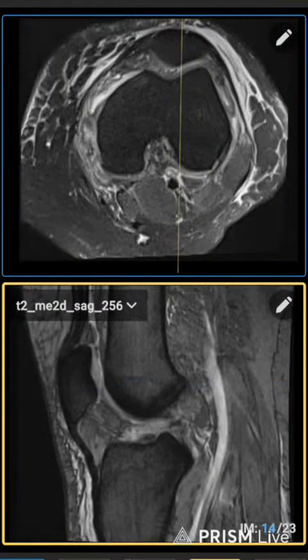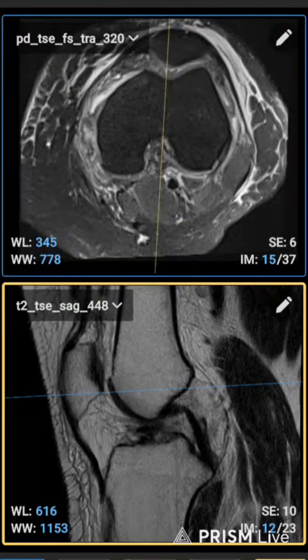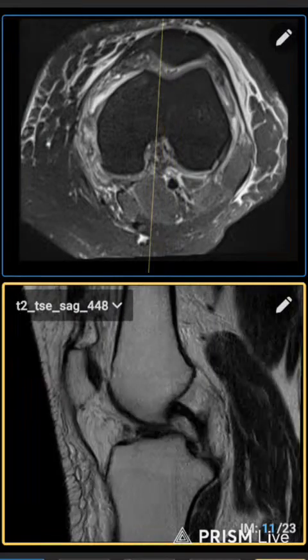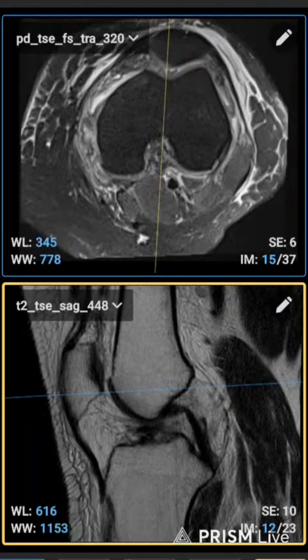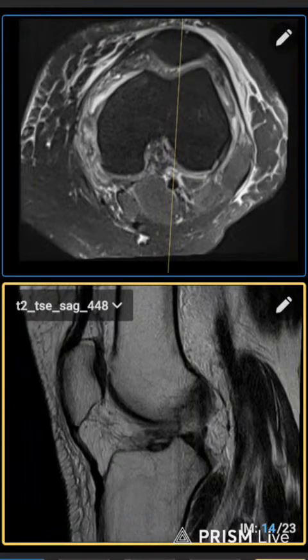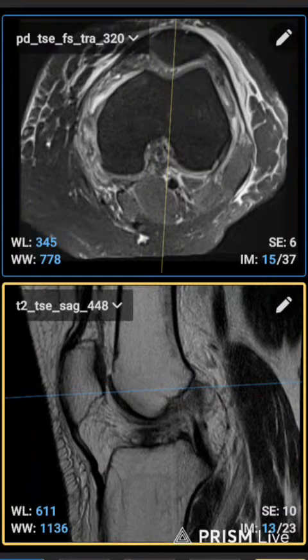If this person was injured by running, so in running if you have a severe injury, or sometimes just running because the patient has heavy weight, so it's happening. The ACL ligament was fractured or injured, so that it's missing in this place, and also there is a lot of collection in this patient. So it is the knee.